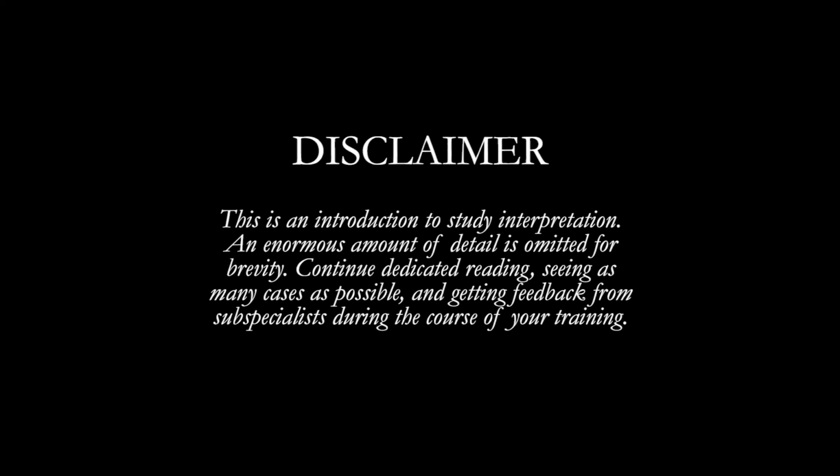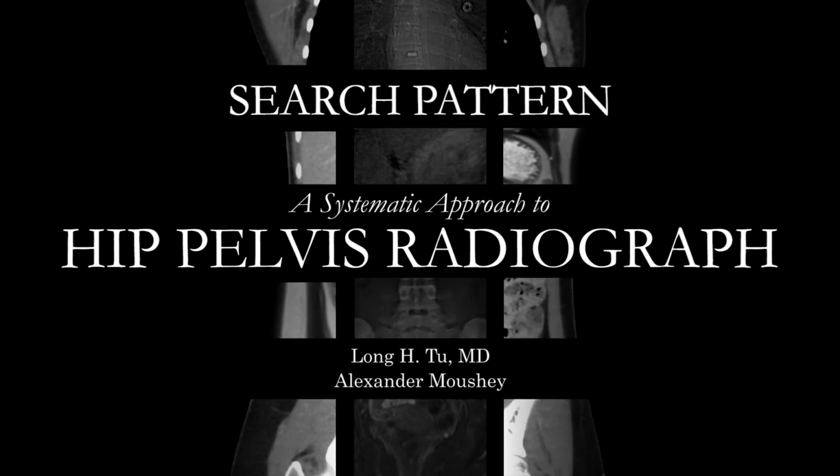Please note that this is an introduction to study interpretation. An enormous amount of detail is omitted for brevity. Continue dedicated reading, seeing as many cases as possible, and keep getting feedback from subspecialists during the course of your training. All right, so today we're going to talk about a basic approach to the pelvic and hip radiograph.